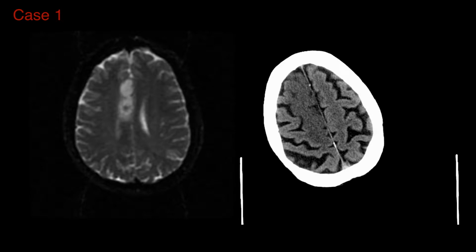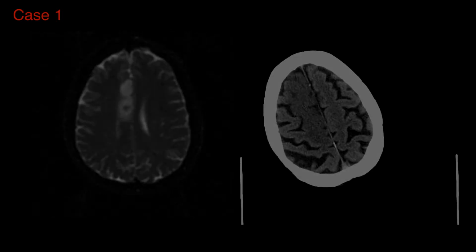So these are two different patients with two different imaging sets. On the right is a CT and on the left is an MRI. So the question is, from the imaging, can we detect what kind of deficits these patients might have? To answer this, we need to know what artery is infarcted, what the vascular territory this artery serves is, and what functions this territory is responsible for.